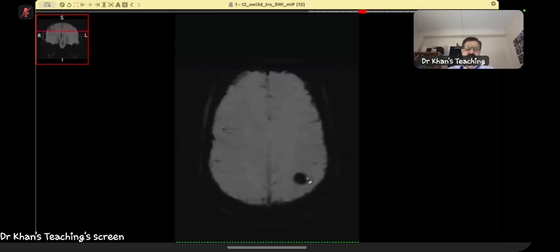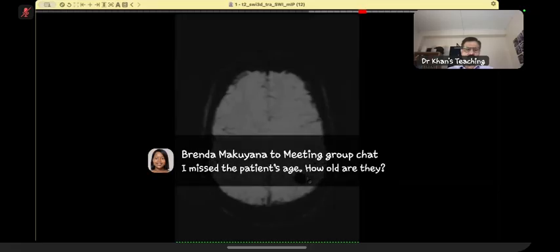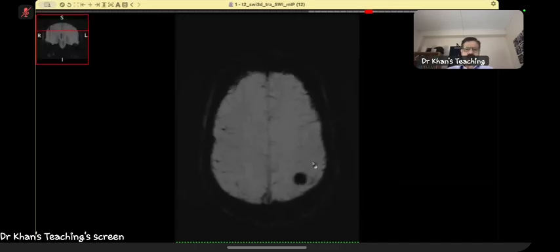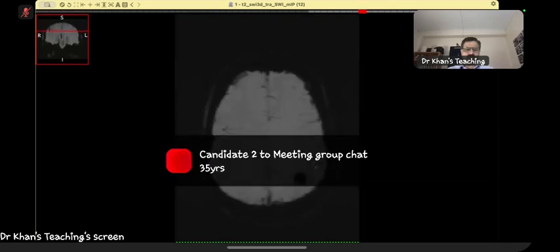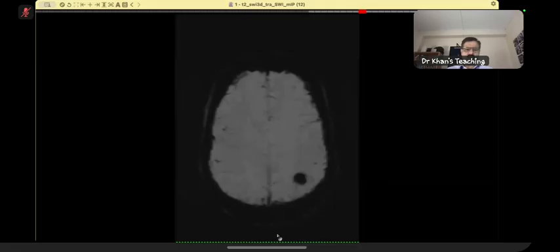So one feedback is that in the differential, you should have moved quickly, number one. And number two, you should have asked for MR. Think like this: in usual practice, you ask for an MR and take it further. So don't waste time there, or in asking for the next modality. Otherwise, you have done very well. Okay, next case.